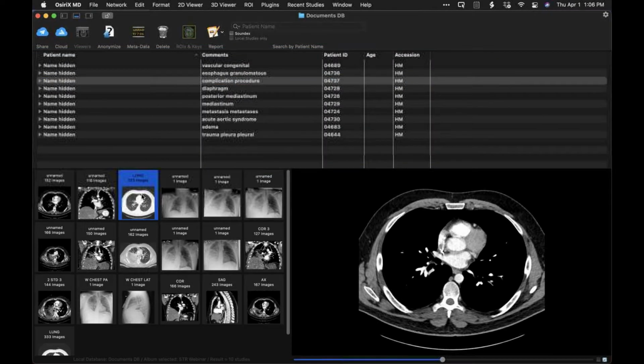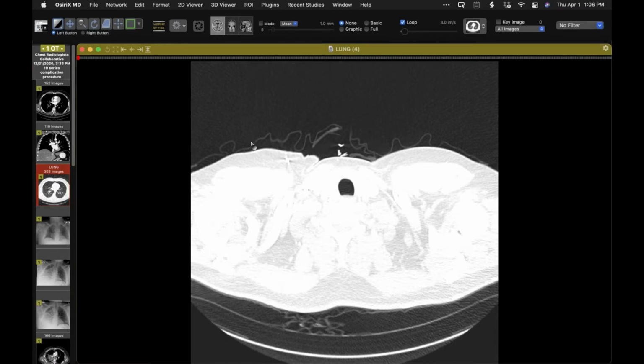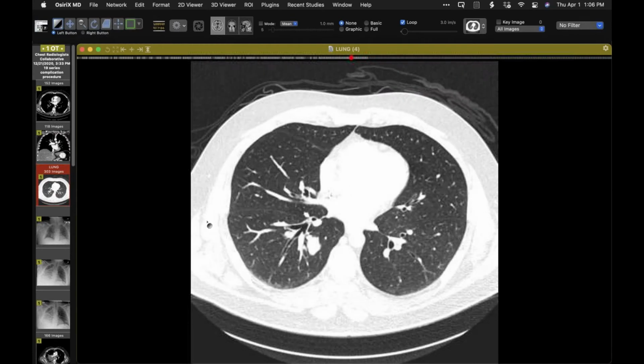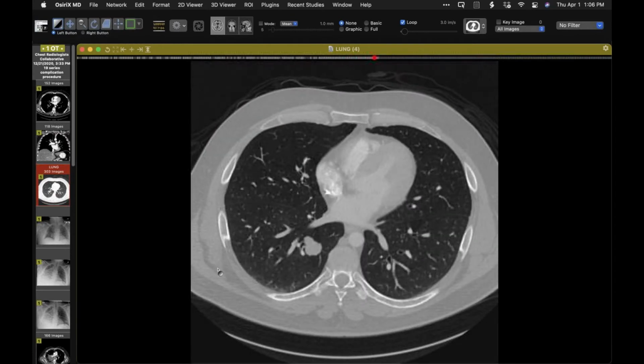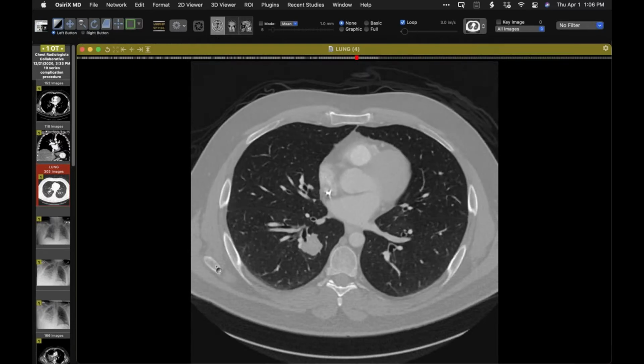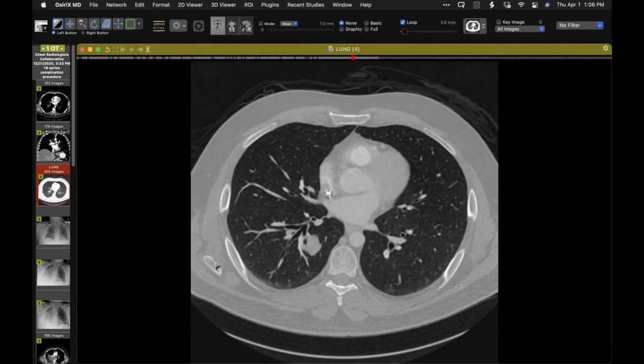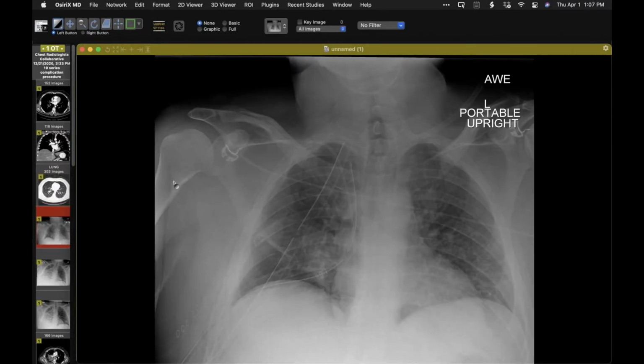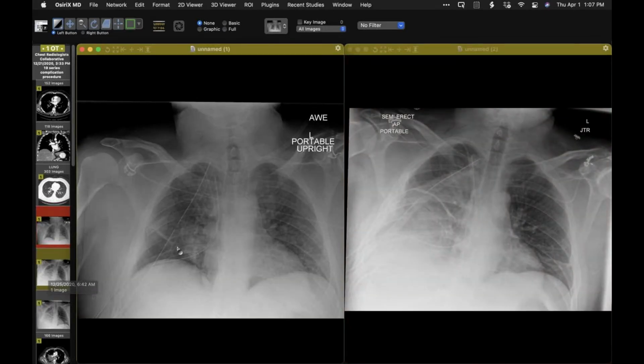This is a patient that has metastatic large bowel cancer, and here is one metastasis, a relatively large metastasis in the central portion of the right lower lobe. It was decided to remove that. So we had the surgery, and here is the immediate post-op with right pleural space drainage tubes in place. And here is a following one. So here we have 2 days between these two.